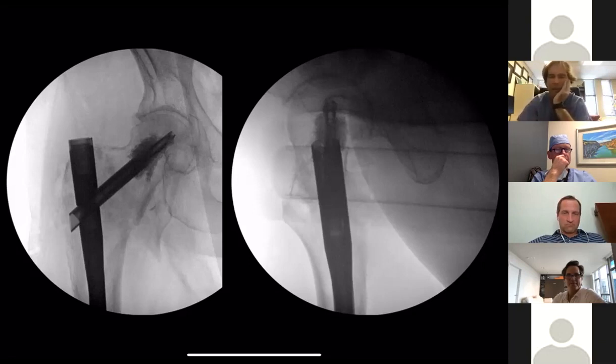Yeah, so is your expectation that this is going to shorten along the axis of the device such that we get some intrinsic stability? I hope. I think it is going to hit maybe up top first and then slide down on the shaft a little bit and then maybe go a little bit of varus, but maybe heal before it all can go bad.